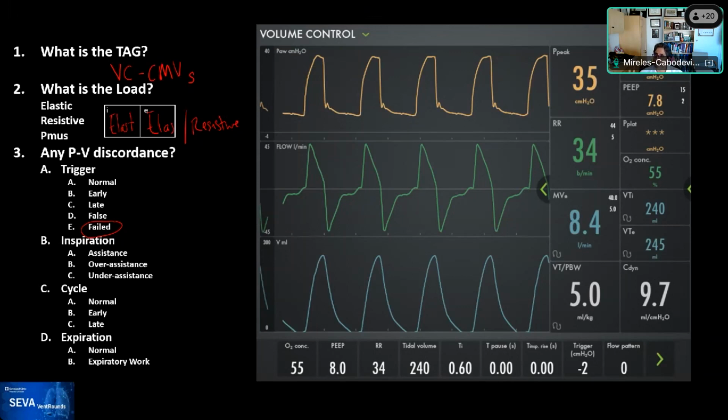And the only way to prove it would be if, when I looked at this waveform, I had pressed the end expiratory pause. And guess what I did? Yes, I did not press it, Fernando. I failed miserably. Or if I did, I didn't record it. And so I apologize to all of you.